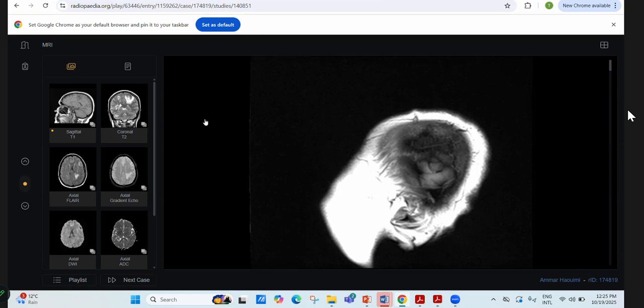You presented this very well, but there were two things I mentioned in the book that you lingered on. I know it's a long case and you have to see further images. But when I told you there's a known case of primary breast cancer, you again went to the DWI and ADC without any reason. There is not enough time for a single case to be checking all the MRI images. Even if I said this is a case of breast cancer, you could wind up that case. You have to save the time for other imaging as well.